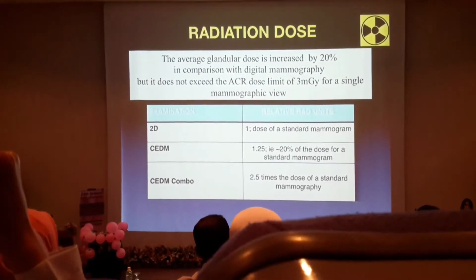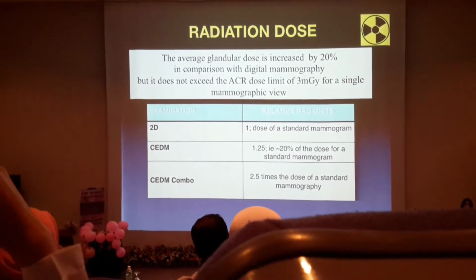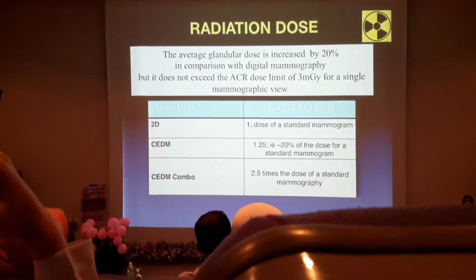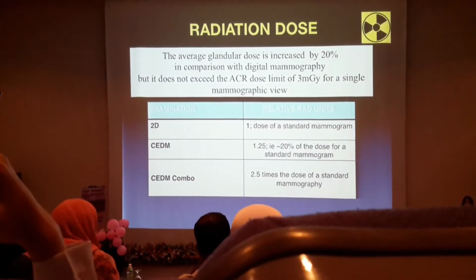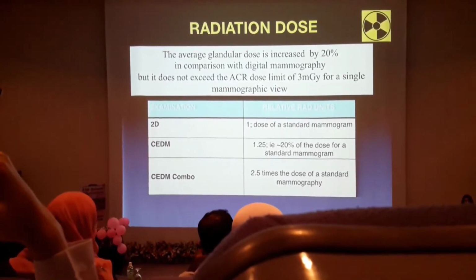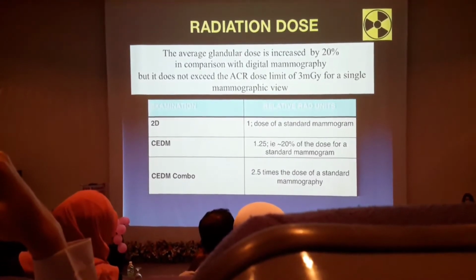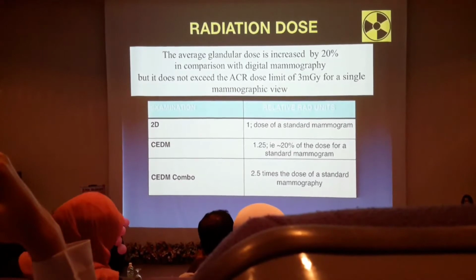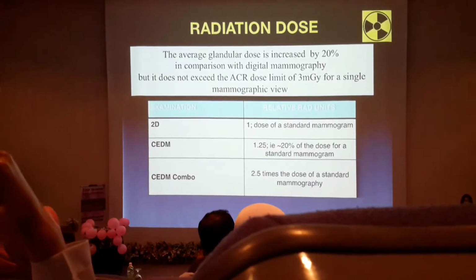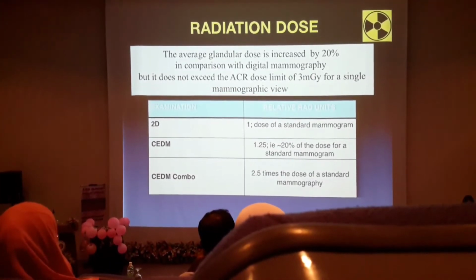And the patient doesn't even need to be seated, we just put the probe there, okay, it's a mass. I would straight away, instead of doing a mammogram first, sometimes proceed directly to a contrasted mammogram, because the first image that we obtain is really a mammogram, the low energy, and after that we get a contrasted mammogram, and it makes it so much easier for us to do an ultrasound after our contrasted mammogram in these patients, because any other lesions other than that big mass enhancing, we can take a biopsy immediately. So we become very much more confident in our post-mammogram ultrasound when we do it directly. So it also saves radiation dose to the patient.